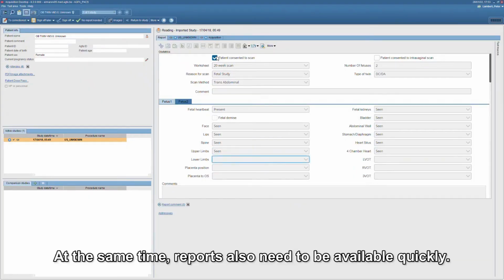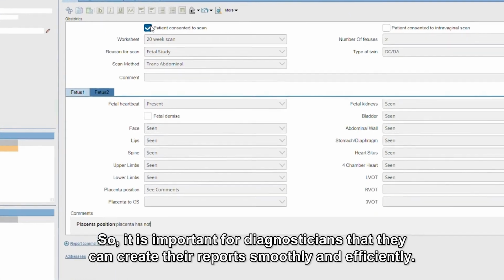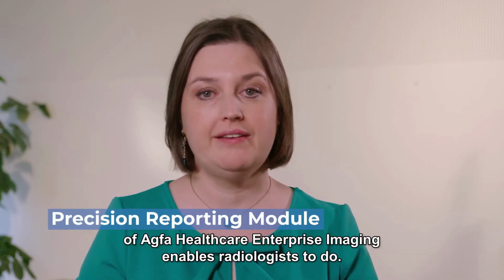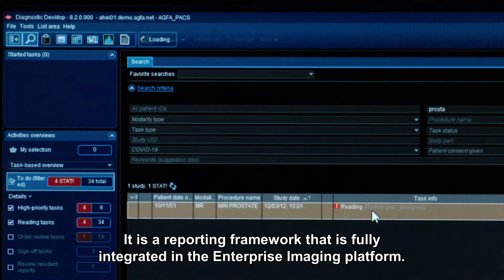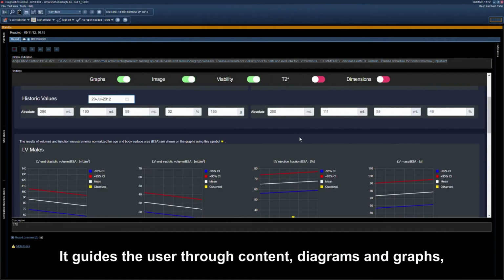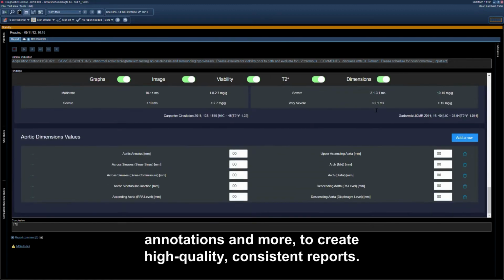At the same time, reports also need to be available quickly, so it is important for diagnosticians that they can create their reports smoothly and efficiently. This is exactly what the Precision Reporting module of AGFA HealthCare Enterprise Imaging enables radiologists to do. It is a reporting framework that is fully integrated in the Enterprise Imaging platform. It guides the user through content, diagrams and graphs, annotations and more to create high-quality, consistent reports.